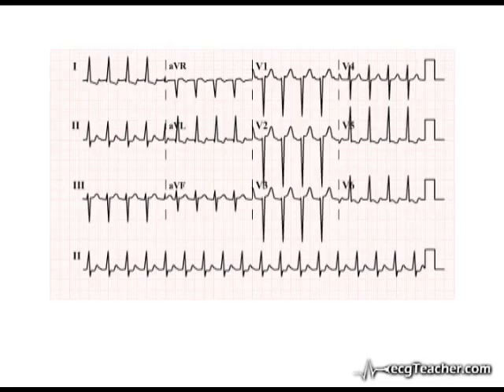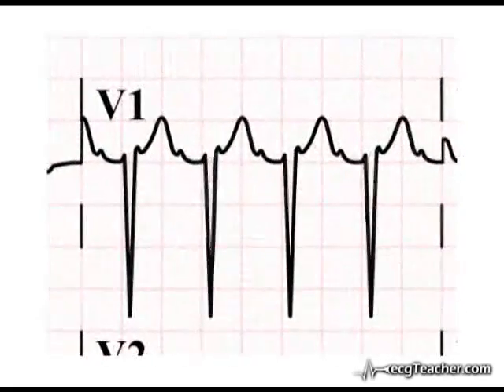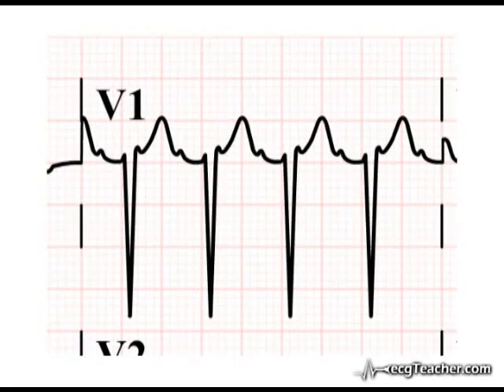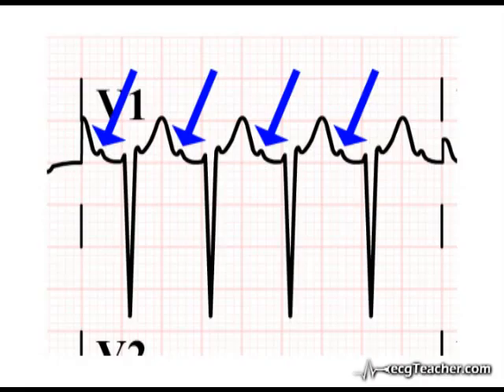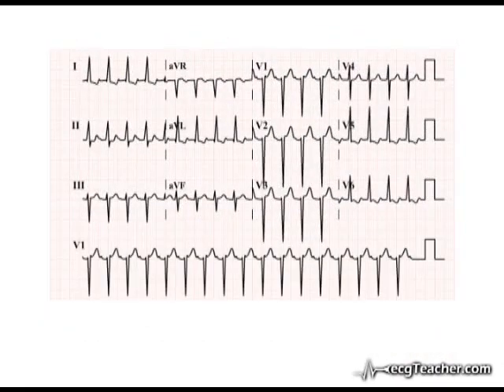This should immediately alert us to the possibility of underlying atrial flutter. Although no obvious flutter waves are present, examining lead V1, however, we note a deflection consistent with P-wave activity preceding the QRS complexes. A repeat ECG with V1 as the rhythm strip shows the deflection to be a consistent feature.